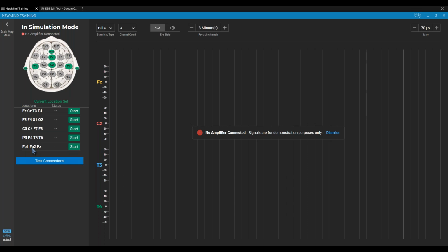I have two choices: either throw all that data away and try to remap them, or just select that data, and when I go look at the map, I ignore those locations. I already know the database is going to recommend that I train in those locations, because the artifact makes them end up being the worst areas in the brain.